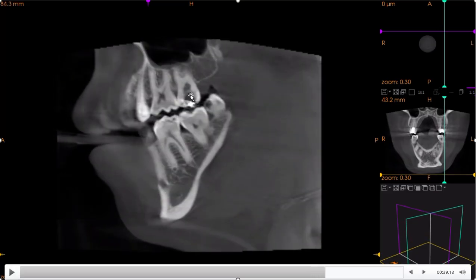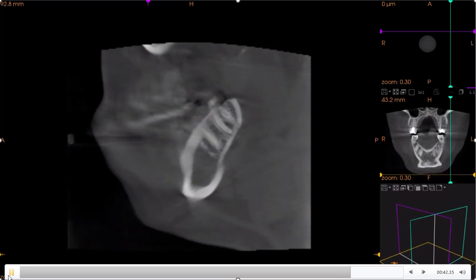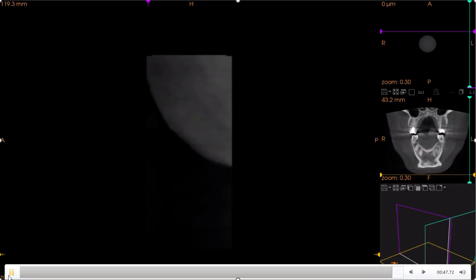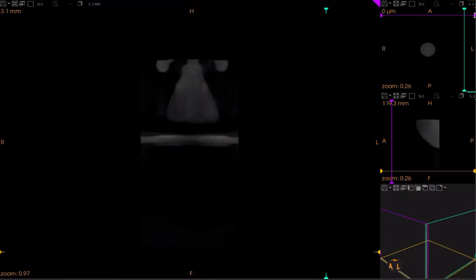Here we can assess caries. As we can see, this one needs root canal, the wisdom needs extraction, and so on. So basically, the CBCT is a very good tool that we can use to plan for implants, to see endo treatments, if they're good or bad, to see treatment outcomes. After a procedure, let's say we removed a tumor, and we want to see if bone formation has happened, we can assess it with the CBCT.